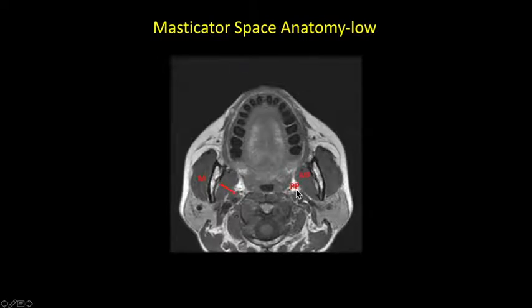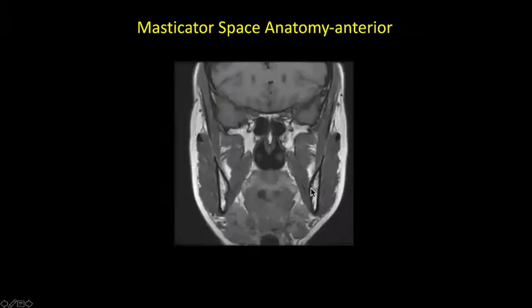Here now I'm showing you the parapharyngeal space, which is this triangular fat pad. You can see anteriorly it's rather narrow, and it doesn't form much of a boundary to disease. You can see it's situated between the oropharyngeal mucosal space and the medial pterygoid.